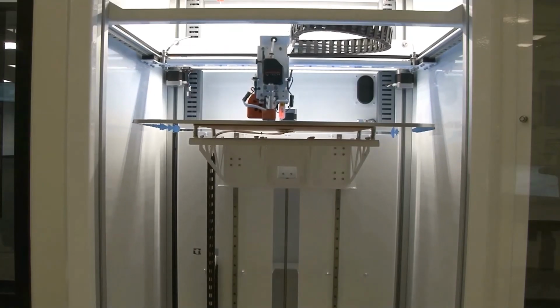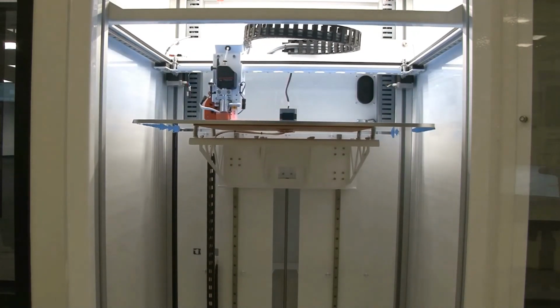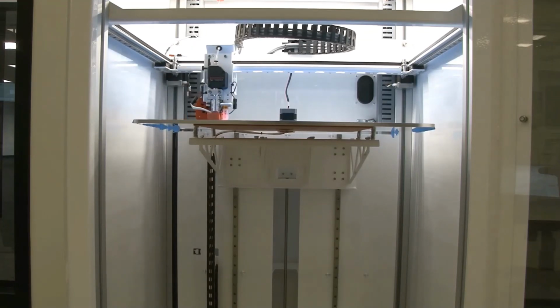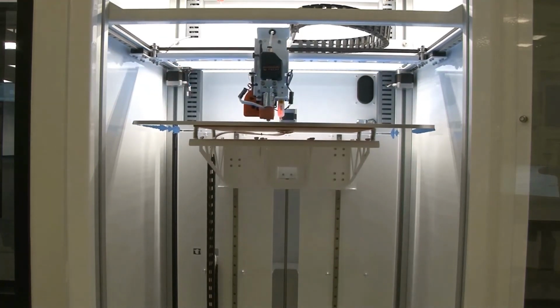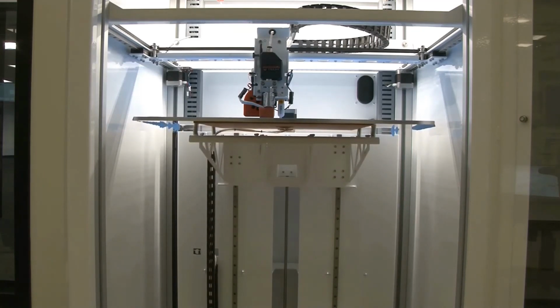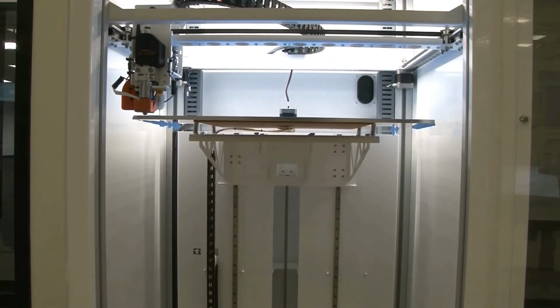Once the print file has been submitted and accepted by the printer, it will warm up both the extruder as well as the print bed to the desired temperature in the G-code. Then the printer will begin its homing sequence, which will go to the back edge of the printer. It will home the X and Y axes, and then lower the print bed until it hits the probe, coming back up and calibrating the print bed on the Z-axis home.